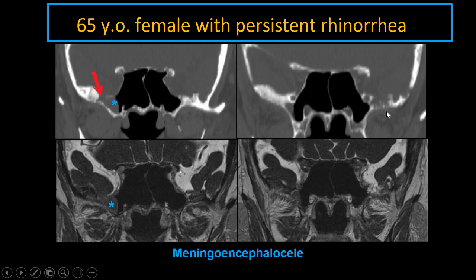On the contralateral left greater sphenoid wing in this patient, we can also see areas of pitting of the skull base with arachnoid granulations extending into these areas on the MRI. Sometimes these features can also be seen in patients with pseudotumor cerebri, but it is not required.